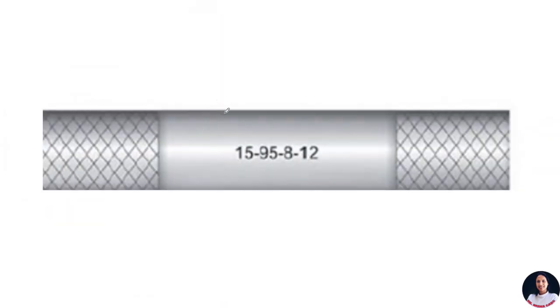Another method to identify whether it's a mesial or distal GMT is to look at the instrument formula. As we all know, hand cutting instruments have 3 or 4 number instrument formula, which is mentioned on the handle of the instrument. Gingival margin trimmer has a 4-number instrument formula.